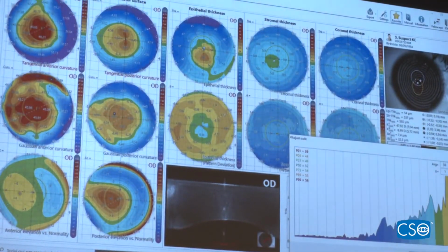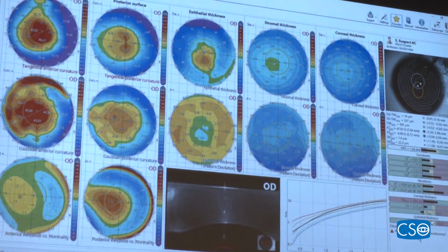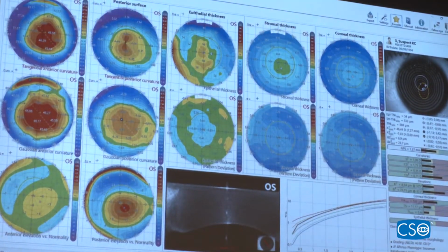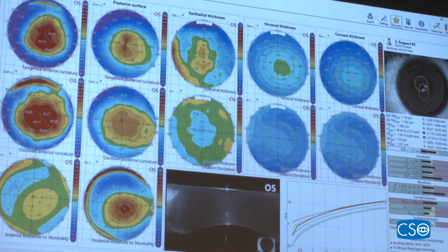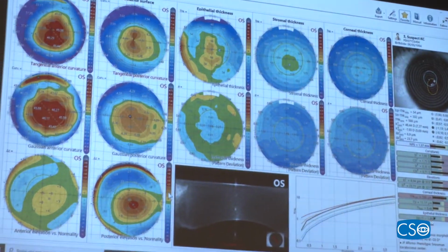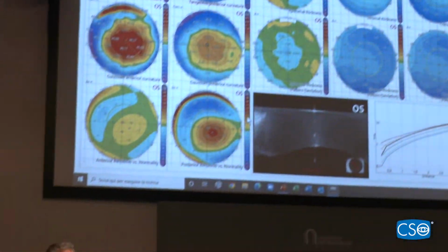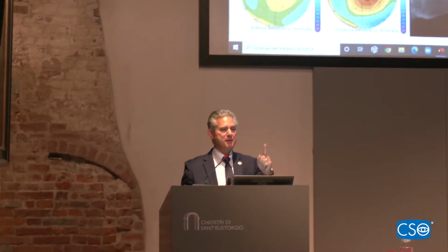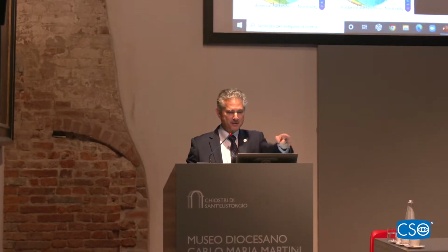And so therefore, although this is classified as keratoconus by shape factors, when you look at the concordance between epithelium and back surface changes, you can confidently exclude keratoconus. And you can do LASIK with a Moria. Actually, you can do it with a flap maker, because that machine made 250 micron flaps, if you remember that.